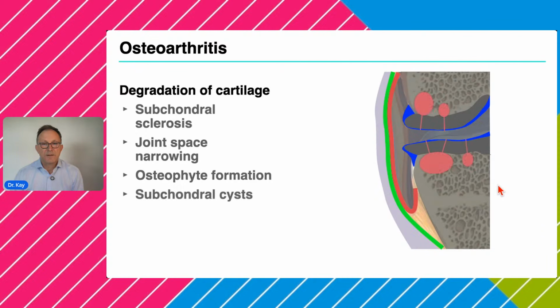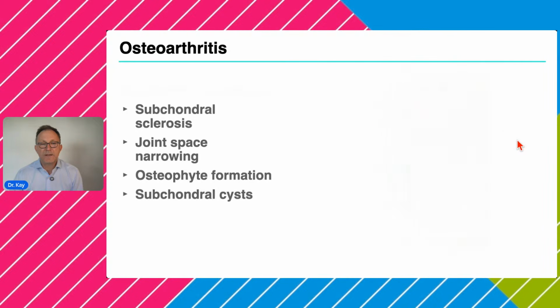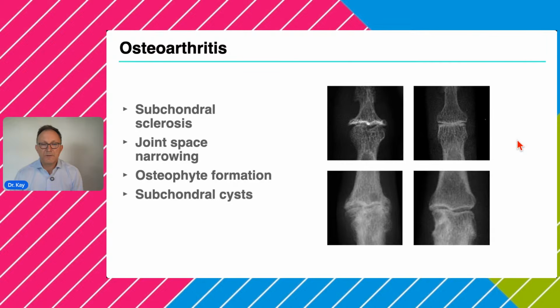And then there are also cystic changes that we can find in osteoarthritis, and these are pressure-related cavities in the spongious bone subchondrally. They are filled by small fissures, and there is joint fluid, synovia, and dead cells, detritus, that are going into these pseudocysts. And with these findings, you can actually diagnose osteoarthritis on almost all joints.